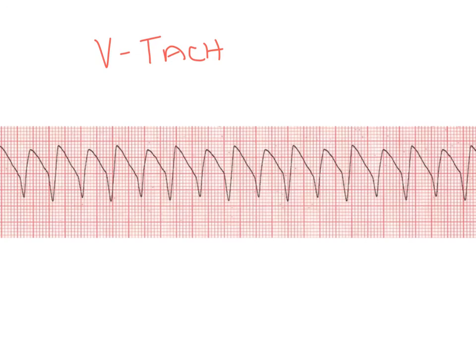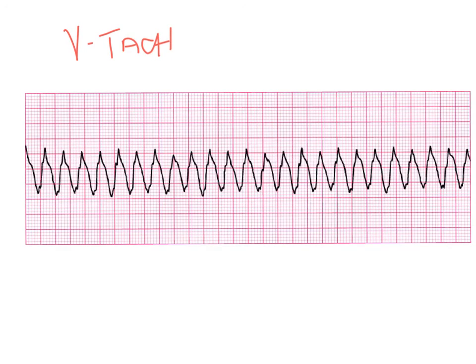This here's an easier one. Still a run of VTAC. If you want to measure your distance, from here to here is 300, here to here is 150. It's greater than 150. Look how pretty much uniform they are. I mean, showing the sequential ventricular rhythm, it's a basic VTAC. It's all uniform in nature. They all look alike. That's something to be aware of for basic VTAC. Another very pretty VTAC. They all look almost alike.